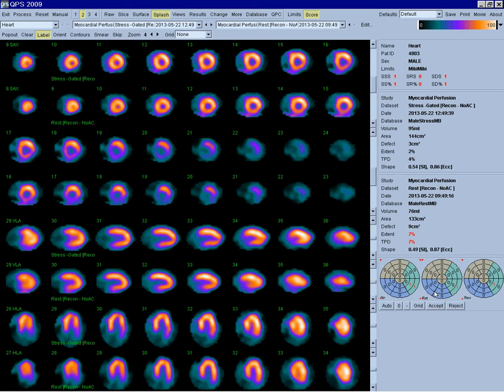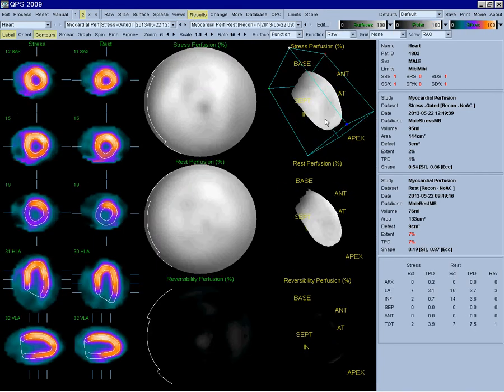This patient in a few different areas has ones, or in other cases might have twos or threes, which means that the patient's heart might be slightly ischemic in the areas that are represented by these bullseyes. So this program tells you, say, the volume of the left ventricle. It tells you, let's see, what's some other good information they look at.